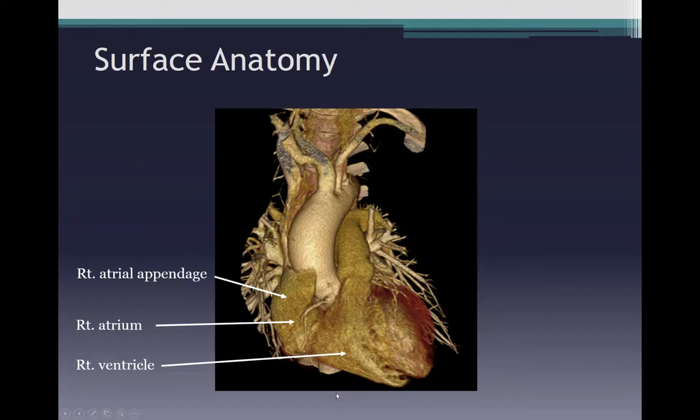Now, the right ventricle leads into the right ventricular outflow tract, leading from the right ventricle superiorly, which in turn leads into the main pulmonary artery, which will be dividing into subsequent branches. The apex of the heart is part of the left ventricle, which is the chamber on the left side of the right ventricle and also posteriorly.